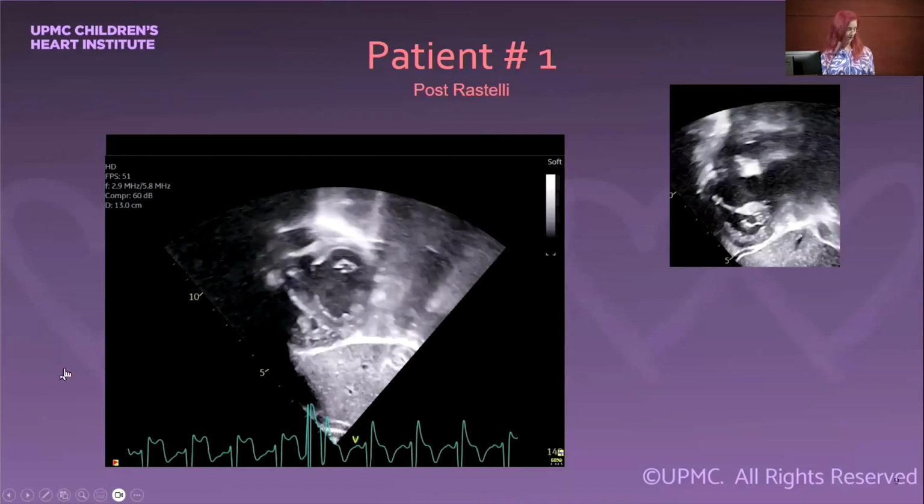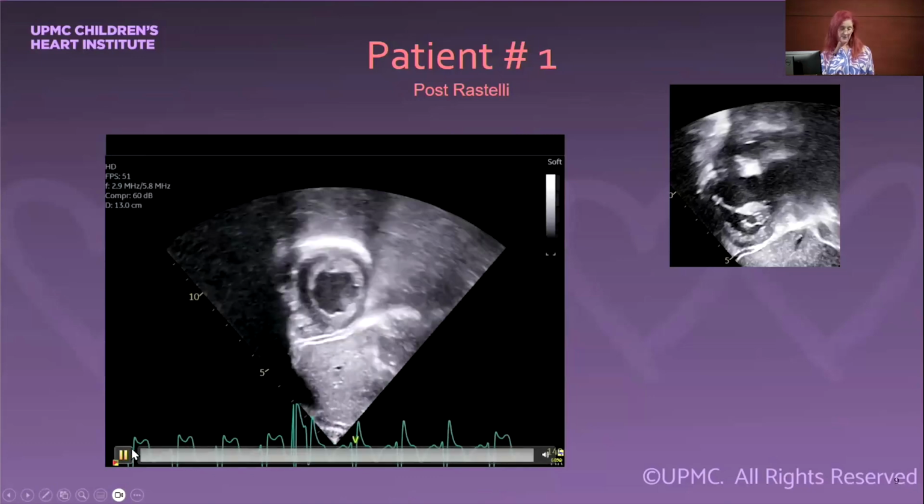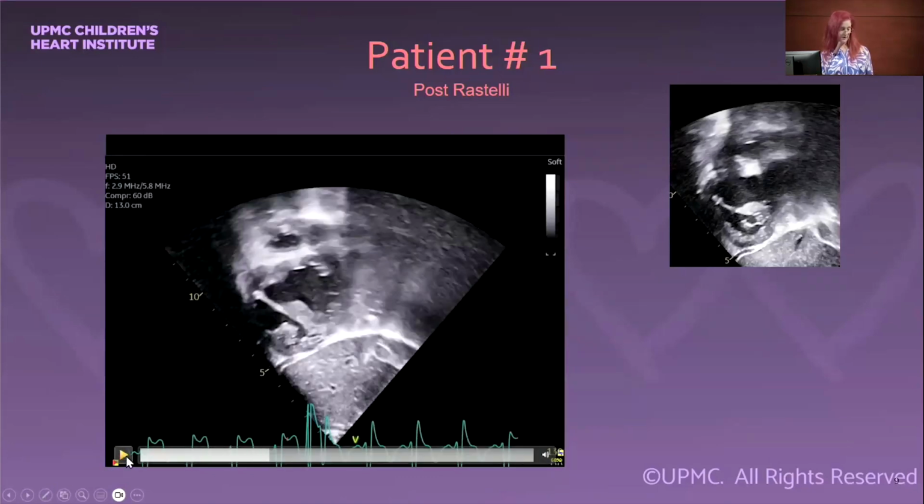So here is a still frame that shows you, sorry, I'm trying to get the other one to stop moving. Here is the aortic valve. Here is the VSD patch. Here is the crest of the septum. So you can certainly see that that VSD is much larger.